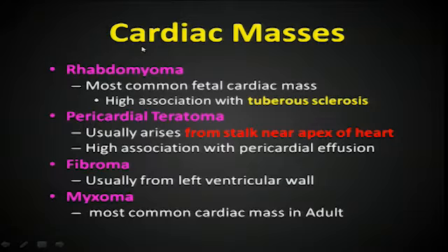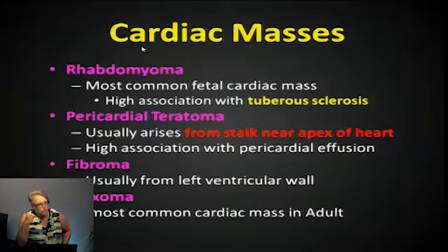And if you see a rhabdomyoma, you're actually looking at the contractility of that muscle. I mean, not only the rate and the rhythm, but how is the muscle contracting? Because with these large rhabdomyomas, it can affect the contractility of that heart.